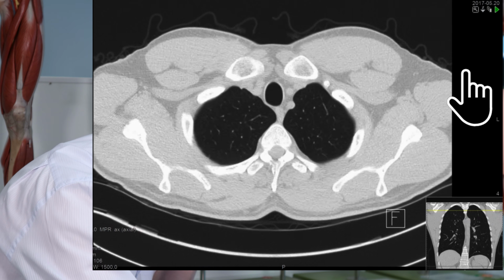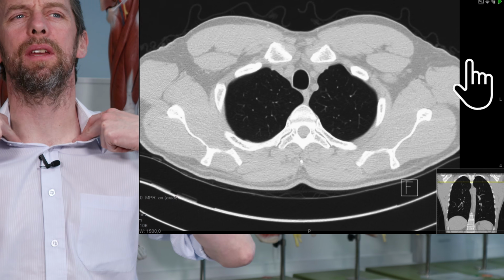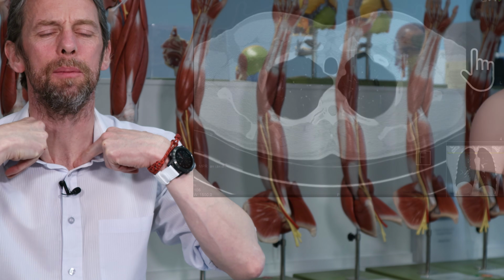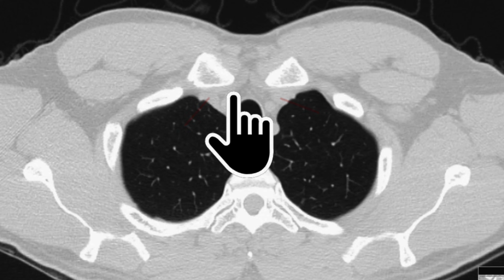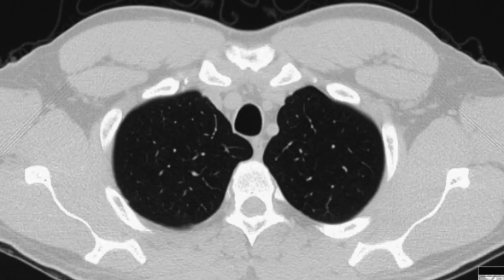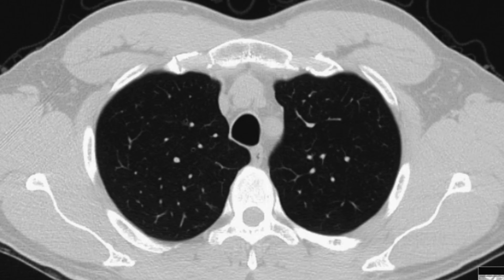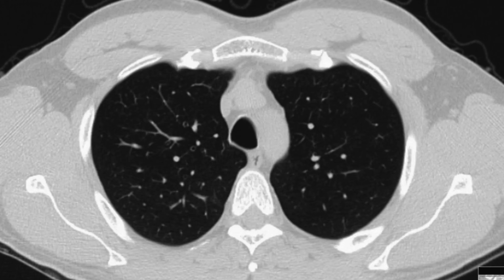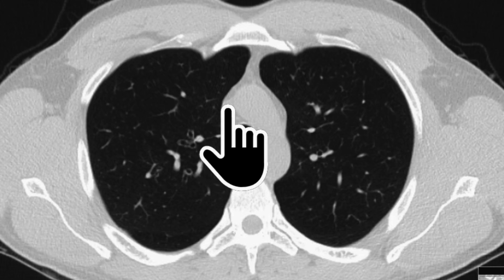So we know that the brachiocephalic veins kind of start just deep to the sternal heads and then go in a bit. So what we're seeing there, closest to the bones, are the brachiocephalic veins forming, and then watch them as we descend, watch them come together, and that left one has got to come across all the way from the left to meet the other one, and now we've got this structure here. They've come together to form that structure there.